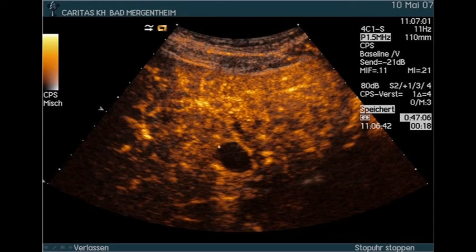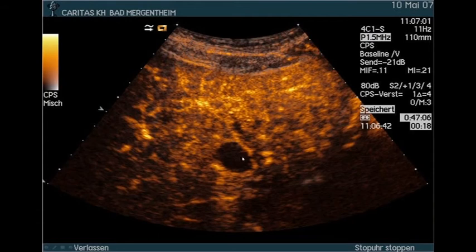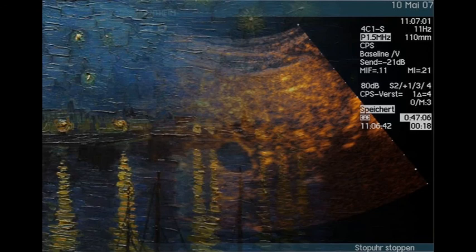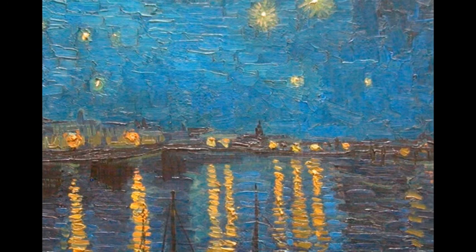Imatinib drug treatment was effective, and all that tumor vascularity was gone. But the lesion, from the size, if we talk about RECIST criteria, would have been still the same. But we learn that quantitative ultrasound, dynamic contrast-enhanced ultrasound, will help us to differentiate between the different levels of arterial enhancement. I hope that I brought some light in the characterization of focal liver lesions.